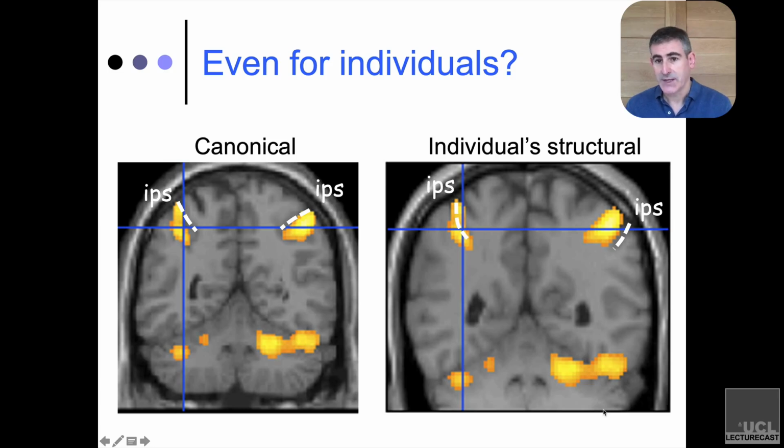The participant structural scan is shown on the right as the underlay, and Colin's brain is shown here on the left. And I've put them at the same resolution, so the Colin brain has lost a little bit of resolution as a result of me trying to make them as comparable as possible. But nonetheless, you can see that the yellow in both cases are the same, right? There's no difference there. What differs is the background image. And hopefully what you can see is the data in the parietal lobes show that there's activation in the intraparietal sulcus in the one hemisphere and definitely in the superior parietal lobe in the other, right? So if there's any doubt about it being IPS, it's IPS but on the more superior surface.